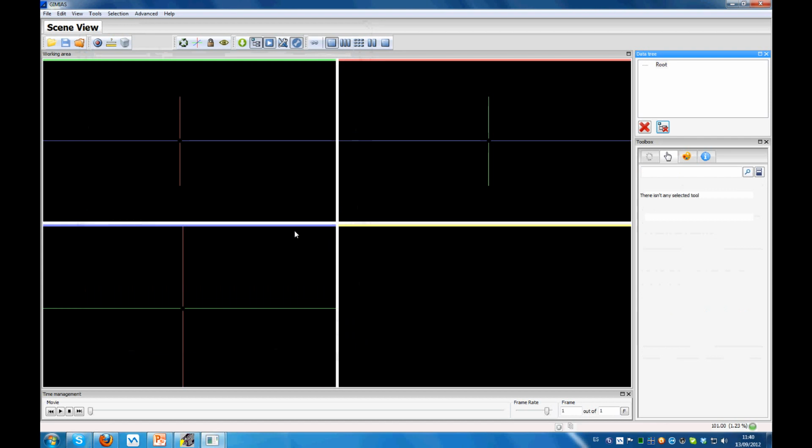Now what we will do in this use case is to configure an external application and execute it in GIMIAS, the first thing, and the second thing we will do is to use Taverna Workbench to execute a workflow and to process a set of images.